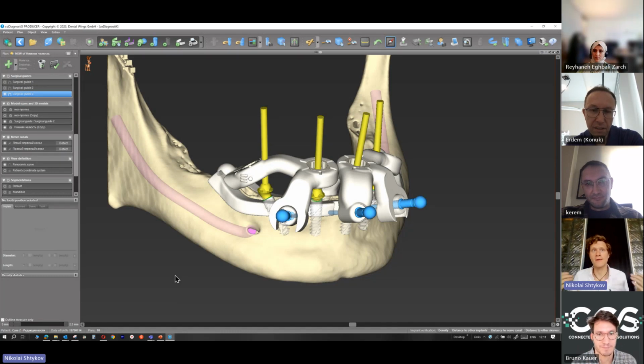And in the lab, I often have conversations with dental technicians who ask me that they can't put the sleeve inside the holes, and I tell them that you need to calibrate, you need to change the offset, maybe change your cleaning of surgical guides, maybe the steps of curing.